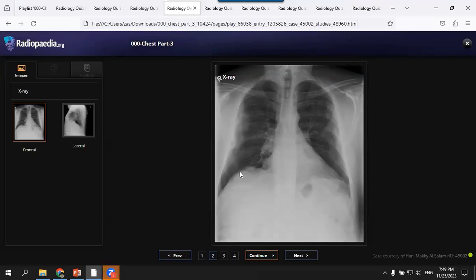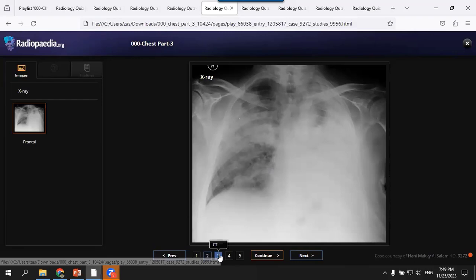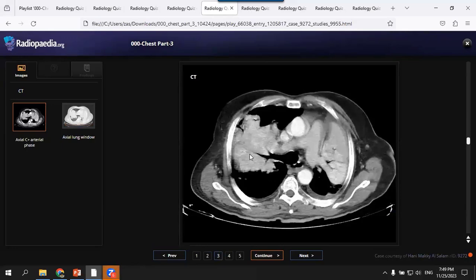If pleural based with pleural calcification, think of calcified pleural plaques of asbestosis. Okay. If non-resolving, what other differential diagnosis than COOP or eosinophilic pneumonia? Bronchoalveolar carcinoma. Yes, this is one of the possibilities you have to mention also.